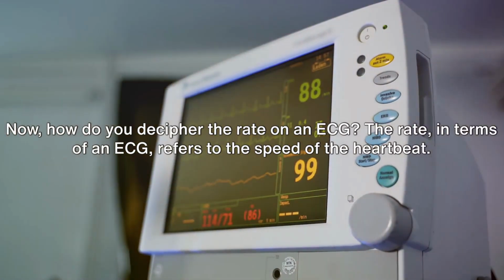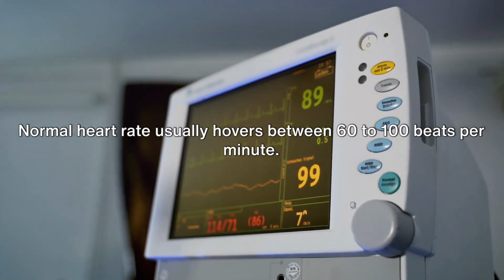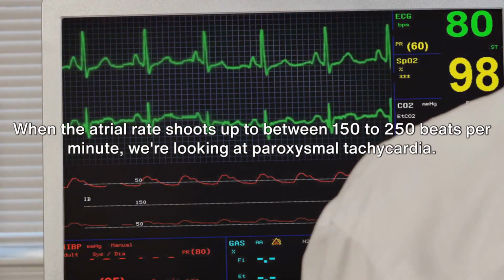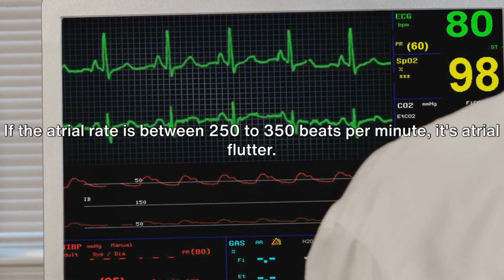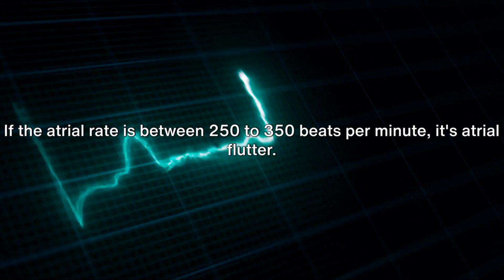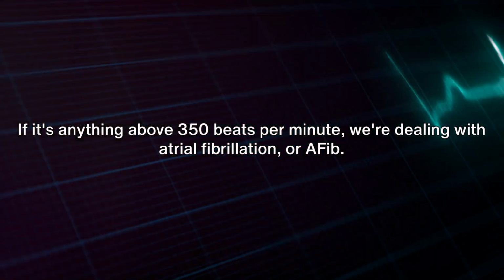The rate, in terms of an ECG, refers to the speed of the heartbeat. Normal heart rate usually hovers between 60 to 100 beats per minute. When the atrial rate shoots up to between 150 to 250 beats per minute, we're looking at paroxysmal tachycardia. If the atrial rate is between 250 to 350 beats per minute, it's atrial flutter. Anything above 350 beats per minute, we're dealing with atrial fibrillation or AFib.